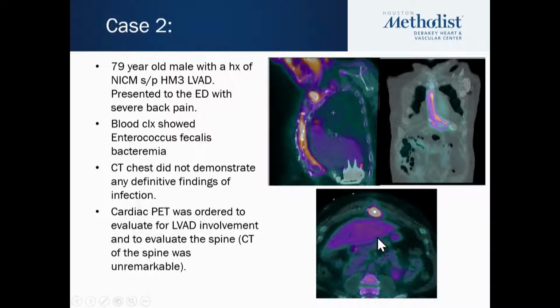But it was a good thing that he came to the hospital because we found that there was extensive uptake in his VAD outflow tract. And this is the drive line. We can see the in situ portion of the drive line has intense FDG uptake as well.